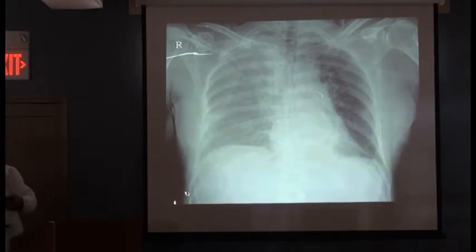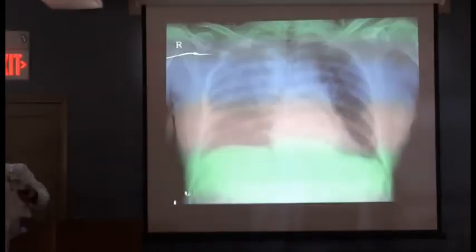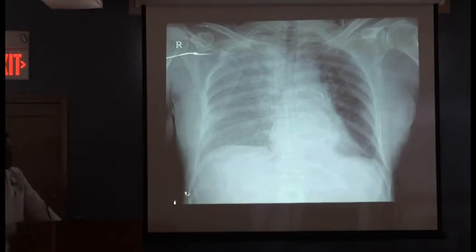Now, I'm going to show you something. This is a clear hemothorax. It's actually probably atelectasis too, right? But this is clear hemothorax. But you got to tell me, this is a trauma patient now, what's going to be causing this that's going to be more dense than this? Not a contusion, because a contusion is first of all going to happen a little bit later down the road. You'll get the contusion at the injury, but it'll start getting brighter down the road. And we'll have an x-ray on that.